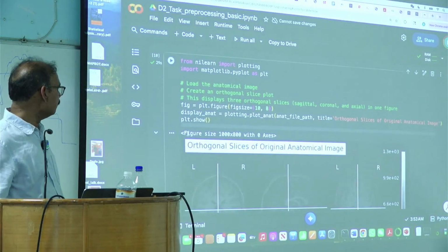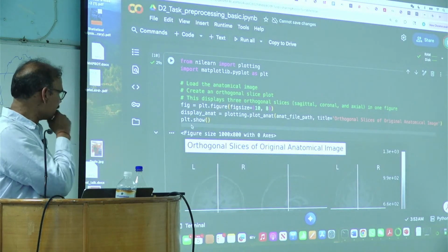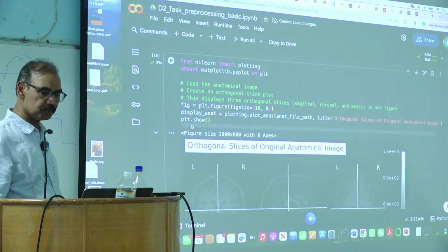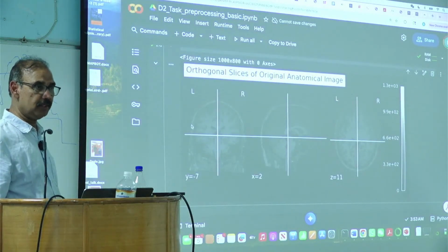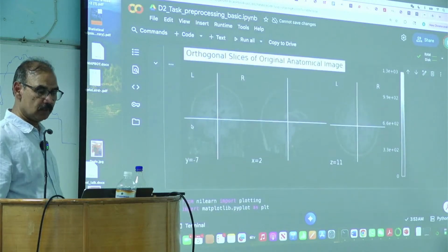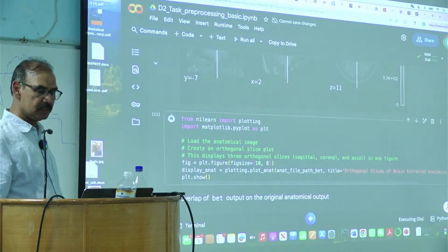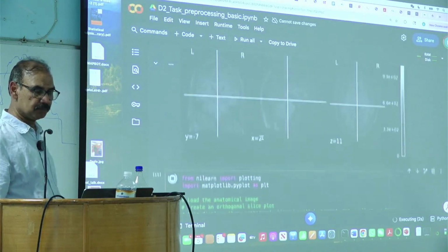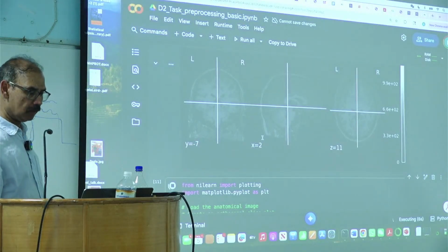So you can, again, try to be up to date so we can look at specific things, right? So this is just displaying the anatomical, without doing any segmentation, which would remove everything outside the brain, including the skull.